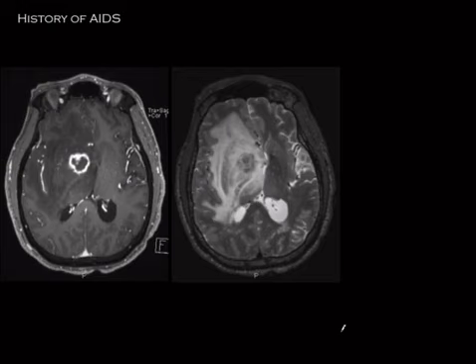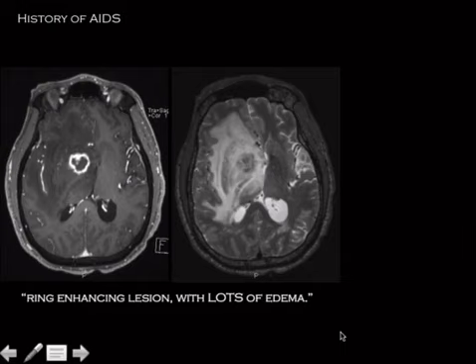And now I'm going to show you the diffusion, and before I show it to you, I want you to mentally run through your head and say, how is that going to be helpful? So, what restricts diffusion? Hypercellular tumors. Lymphoma is the classic one for multiple choice, but GBM, medulloblastoma can also.